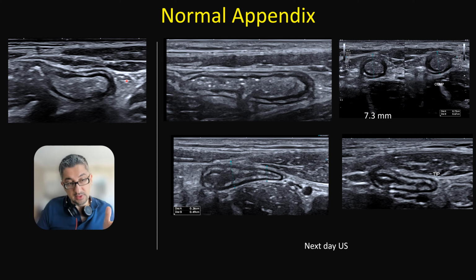On the initial ultrasound, the appendix looked very distended, even measuring over 7 millimeters. And there were echogenic structures within the lumen of the appendix that were mobile. For example, here, mobile echogenic structures, and here, this one. This one has some posterior acoustic shadow, and these ones too, but this one didn't have. So there are some echogenic foci, but they don't look calcified. They are not echogenic enough. And the posterior acoustic shadows are not like a calcification.